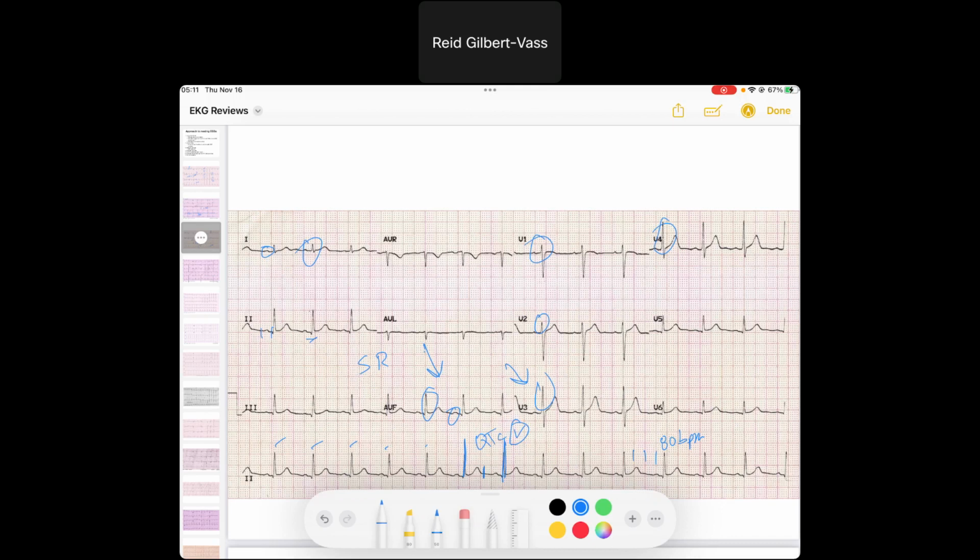And so we scan, we look at all the anatomical leads, we look at maybe the lateral leads in V5, V6, and 1, and AVL for ST changes. I don't see it. We might look in the inferior leads. I don't see any ST or T wave abnormalities, septal and anterior leads. And so this is just a normal sinus rhythm.